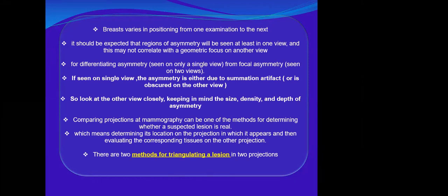Comparing the two projections at mammography can be one of the methods for determining whether this suspected lesion is real or not.